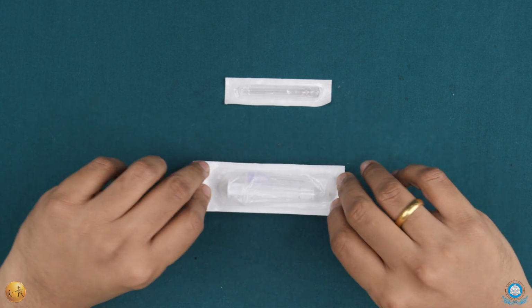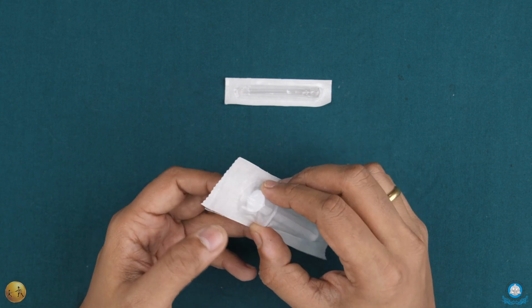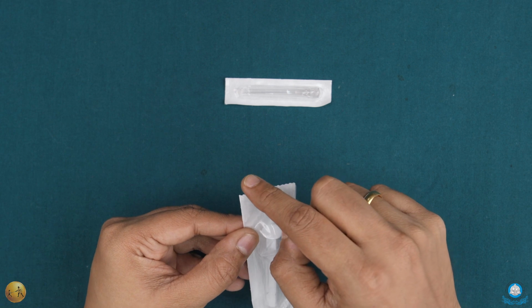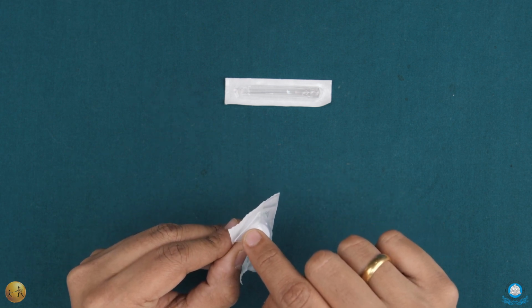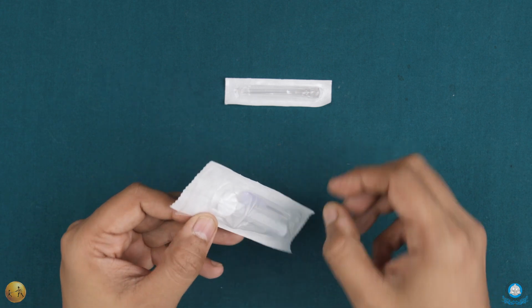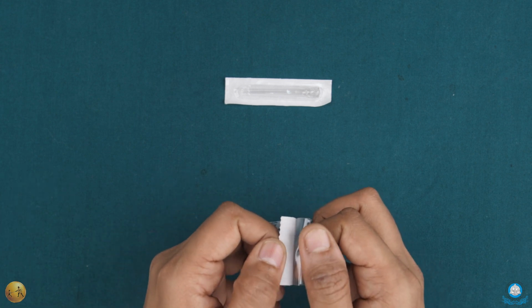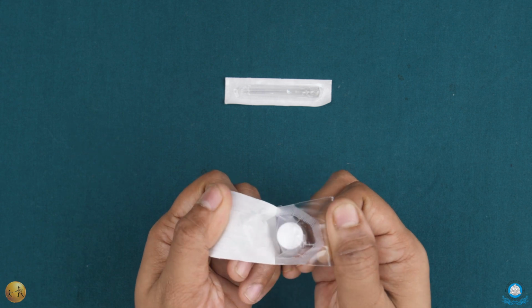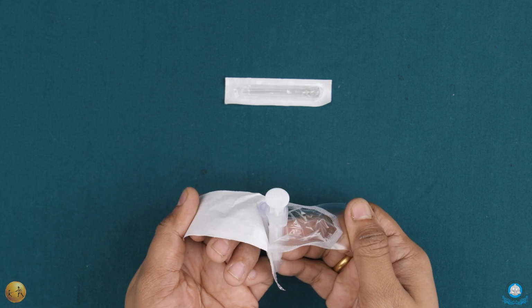Okay. Now with that basics in mind, we now go towards opening the syringe. Now how do you open the syringe? If you notice, right at the end, you will see that there is a flap of plastic that is separate from the paper. So this is basically called a blister packaging. What you do is there are two ways. The first thing, you have to hold the plastic and the paper and you need to separate them. That is basically how you open a syringe.